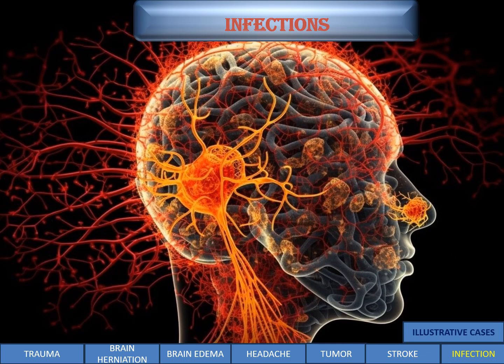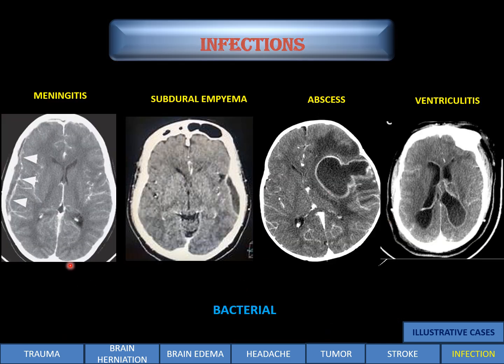Coming to the last part of the illustrative cases, namely infections. For all infections, it's better that you give a contrast to look for the various abnormalities.